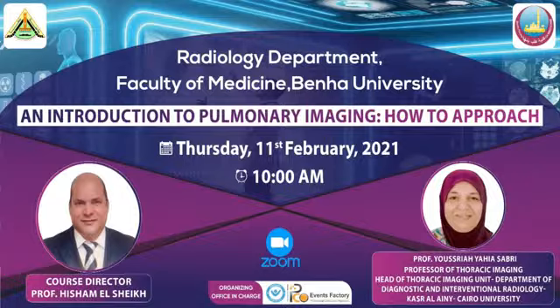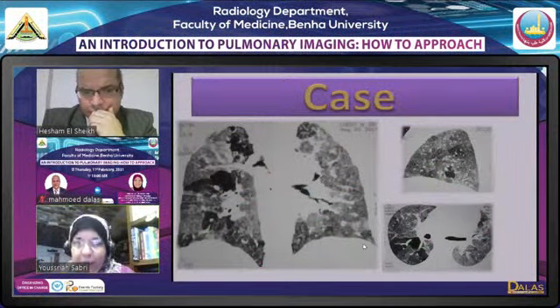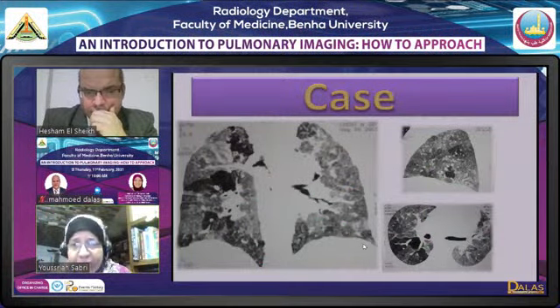فالمنظر اللي قدامنا ده، انا عندي bilateral diffuse ground glass with intervening lucences ما فيهاش vessels، وintervening lucences بتعريفه فيها شويه normal lung marking. again هذا الديفيوز appearance ده مش منظر من مناظر الكوفيد خالص. الكوفيد بيبقى باتشي جراوند جلاس، مش الجراوند جلاس هو اللي ملك الدنيا وانترفيننج موزايك برفيوجن. مفيش موزايك برفيوجن في الكوفيد اصلا.